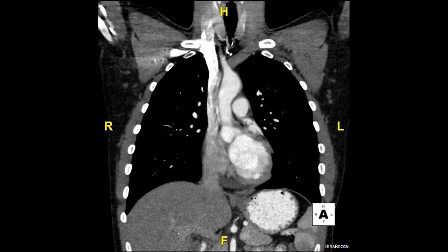We can now see the superior vena cava connected to the right atrium, confirming that we correctly identified that chamber of the heart a few slides ago. I'll quickly outline the superior vena cava in purple right here, and then circle again the right atrium in green.